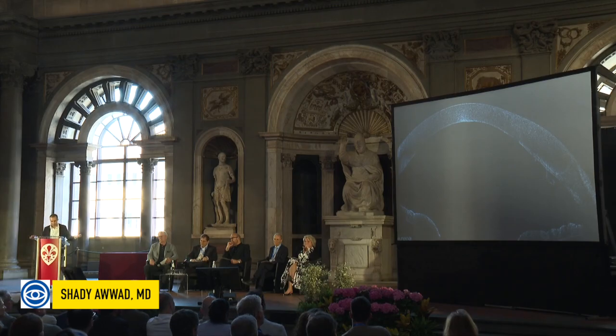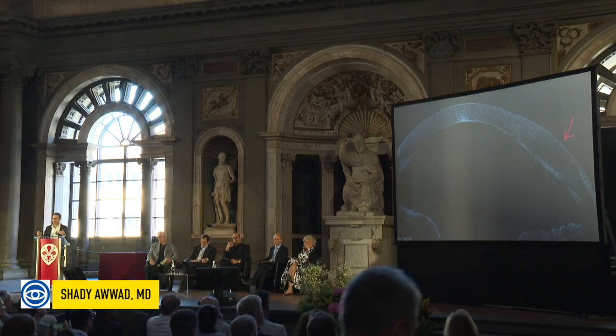If you look here at post-DMEK surgery, there is a part of the cornea which is still swollen. Is the graft attached or not? And more importantly, is it in the right orientation or the wrong orientation? And again, a raw scan is the best scan for me to tell me what's going on. I'm really looking for noise here. So again, this concept that we need to see a smooth, nice image is not always nice.